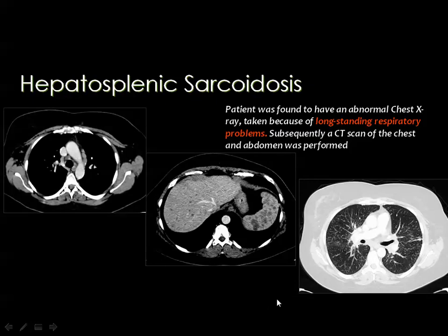The scans of the chest show interstitial opacities as well as minute nodules, and the mediastinal window shows slightly enlarged lymph nodes in the prevascular area as well as posterior to the superior vena cava. Then the presence of lymphadenopathy, especially if the lymph nodes are discrete and homogeneous, as well as interstitial pulmonary opacities, is suggestive of sarcoid.